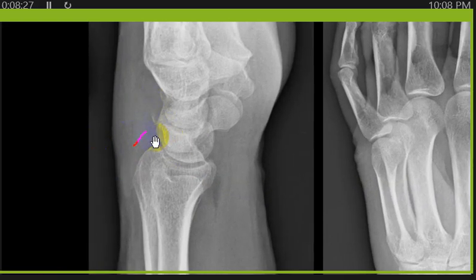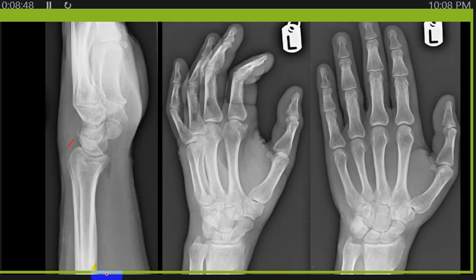This is the avulsion fracture, and this is the soft tissue surrounding the avulsion fracture on the dorsal aspect of the wrist. Any sign for this? Pooping duck sign. Pooping bird sign. Okay, very good, very good.